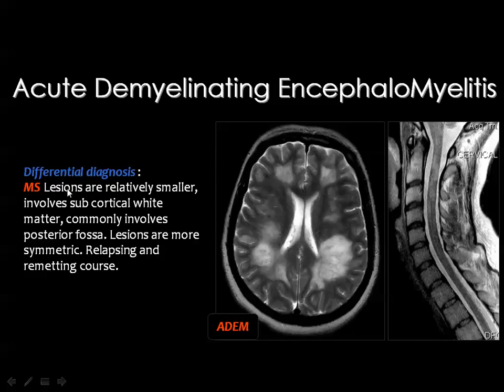In MS, the lesions are relatively smaller compared to the lesions with ADEM, and MS involves the white matter mainly, but ADEM can affect the cortex as well.